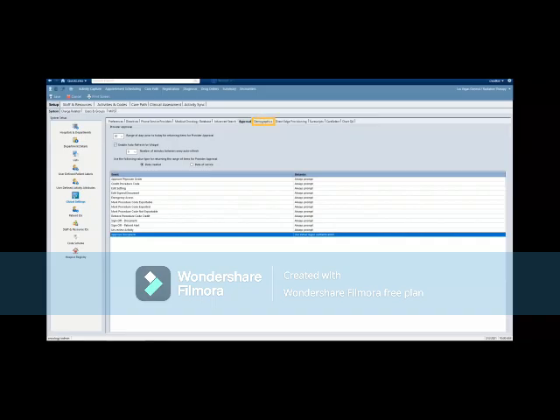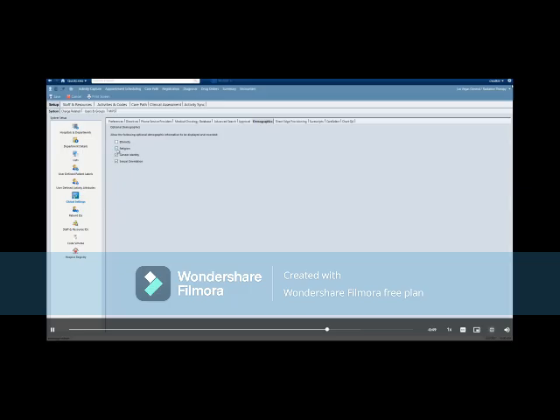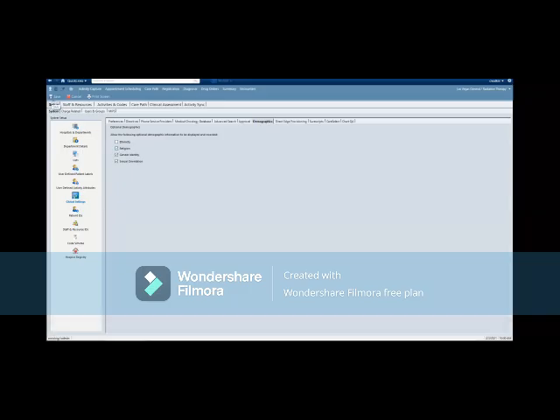To configure optional demographics, select Demographics. Select the options. To configure collimator tolerances to highlight in the treatment history of Chart QA, when a value has been exceeded, select Chart QA. Type collimator tolerance. Click Save.